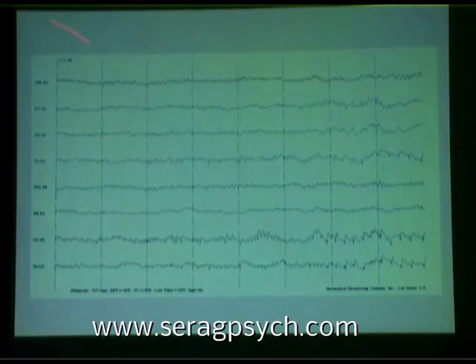And there's not much happening on the left side, but here you see right around here, you have a brand new phenomenon as sequential spike discharges, which cancel between the negative T6 and the negative O2. You can see T4 going down to T6. T6 is negative, and then the negative T6 is basically canceling with the negative O2. And you can see how this evolves a little bit now, and now you have an evolution just like seizures. They always evolve, not involve, evolve. In other words, they change.